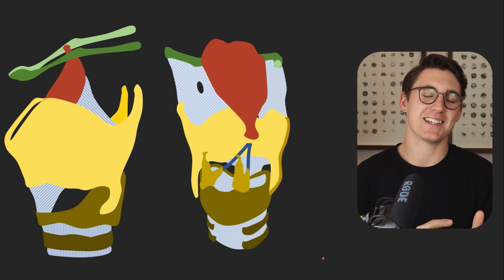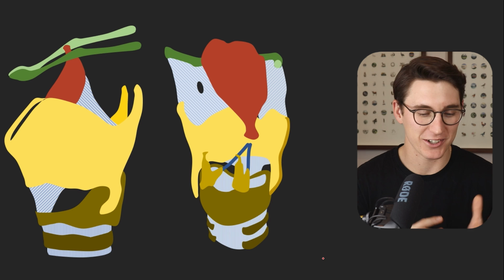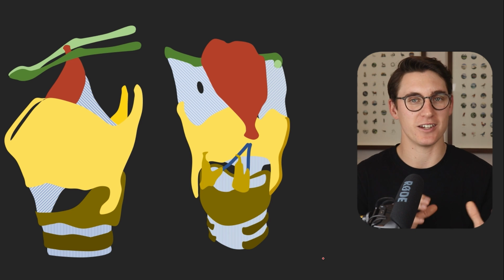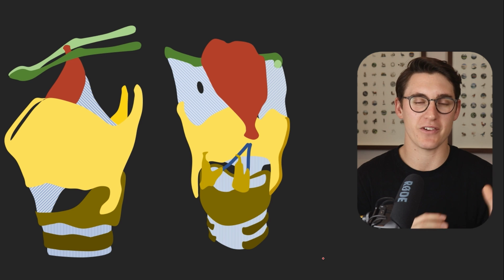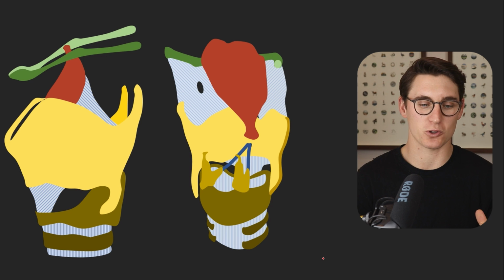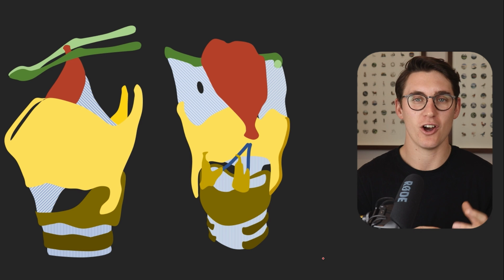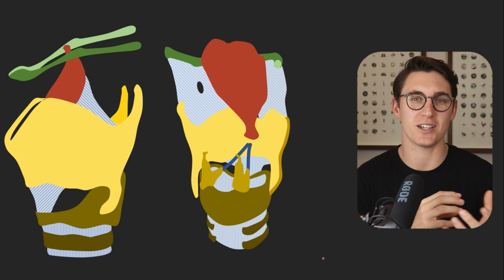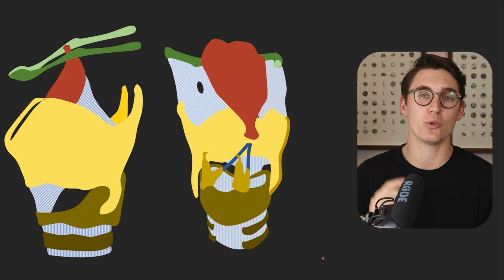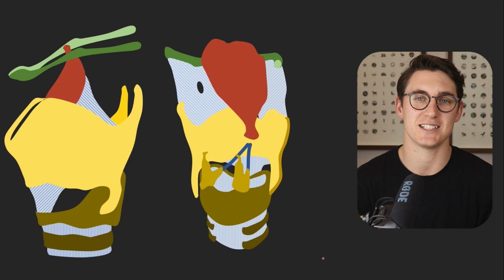Today we're going to be looking at the anatomy of the larynx. Now I know this is a topic that many people find difficult to conceptualize, the 3D relationship between the various different components that make up the larynx. And hopefully by the end of this talk we'll have a much better understanding of how the various structures fit within one another. We'll start by looking at this diagram that I've made and then move on to look at these structures within the CT.